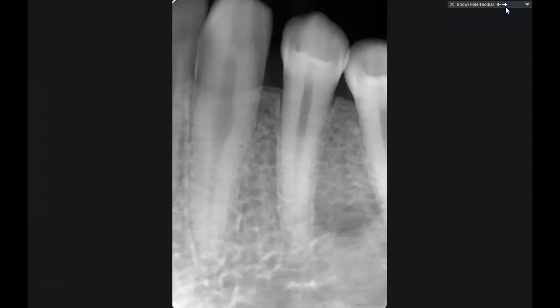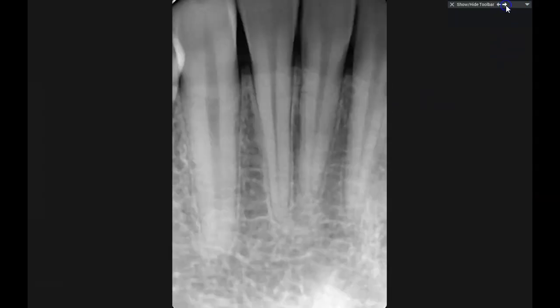The other thing that you don't see here that is very frustrating: we're all dentists and we know what these teeth are and what the teeth numbers are, but other proprietary competitors of Planmeca usually open these images in boxes that tell what that particular tooth, what that image was, what tooth number these are, for example. So you have none of that.